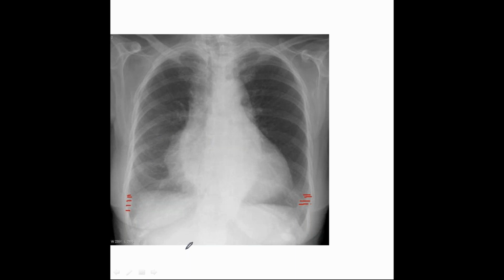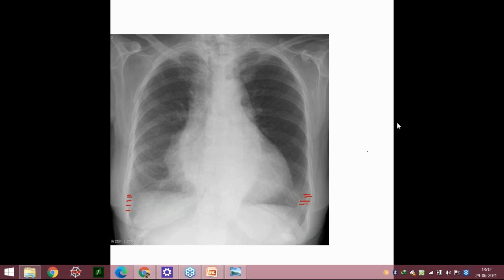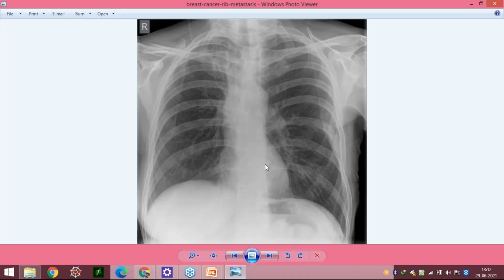Okay, so if I say this, what can you see in this X-ray apart from A, B, C, and D? Is this image visible for you guys? Okay, so now see the X-ray and tell me. A, B, C, I don't need your comments. I am making it easier. What you can see in D and what you can see apart from A, B, C, D.